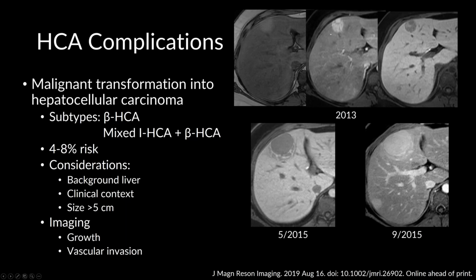And I think looking back on this, we can see that there was a nodule-in-nodule appearance, and it's actually this part of the lesion that grew, and you can see the rest of the lesion is being compressed by the HCC. So this nodule-in-nodule appearance is something that we need to watch for as well.